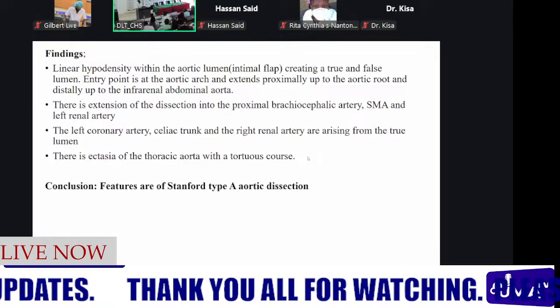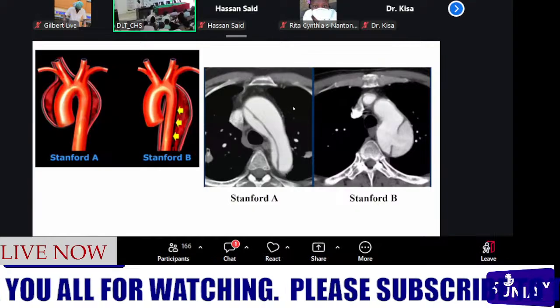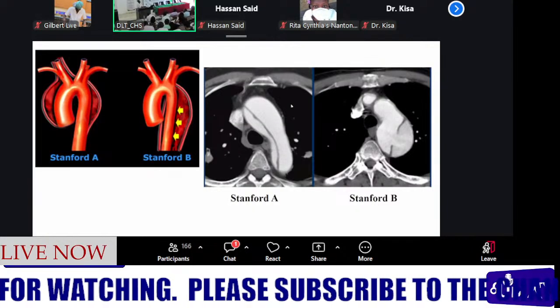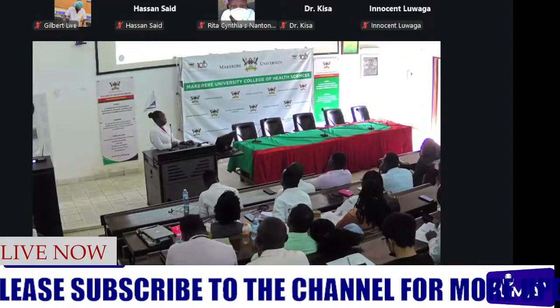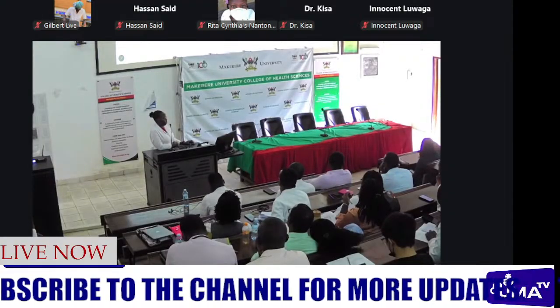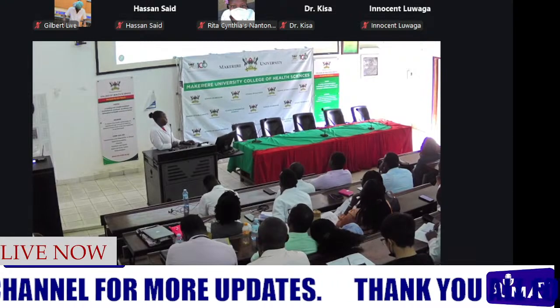Okay. So we shall continue. So I've just put a few comparative images. One, we shall go through a complete case of Stanford type A. Then we shall look at some images of Stanford type B, aortic dissection.